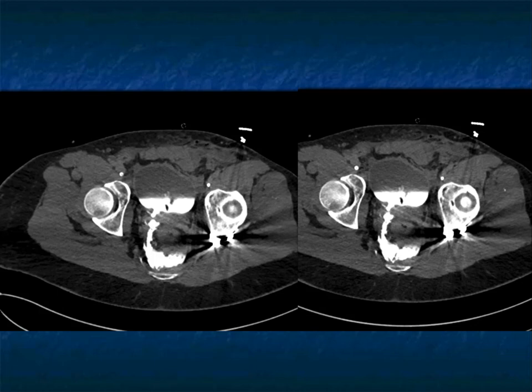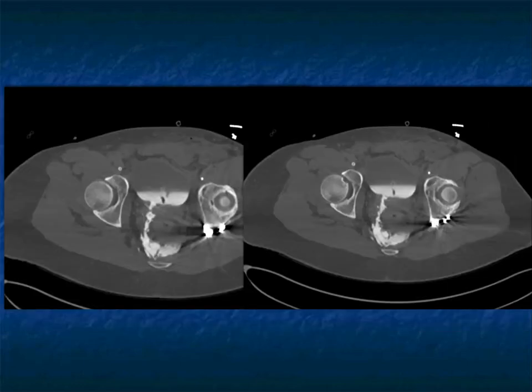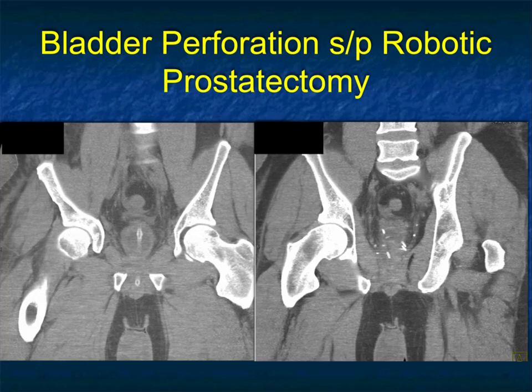So you want to do a CT cystogram. When you do the CT cystogram, look at the contrast pouring out of the posterior right wall of the bladder. A beautiful example of a tear in the bladder wall, a leak which needed surgical intervention. If you only went from the non-contrast scans, you would have missed that. Look how obvious that leak is, because with gravity, contrast is entering the bladder, and as fast as it's entering, it's going down that fistulous tract with fluid congregating in the presacral space. Just a really nice example.